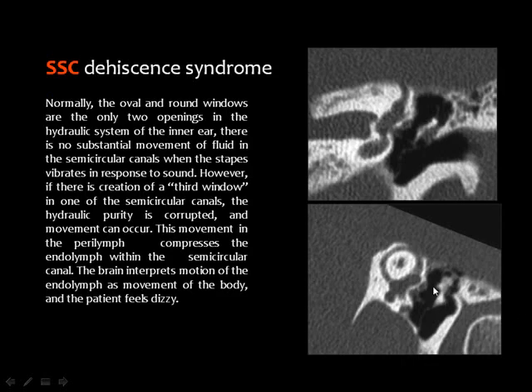And using the CT scan, we can have these very beautiful images for the superior semicircular canal reconstructed in a sagittal oblique image. Then you can see most of the superior semicircular canal is separated from the cranium by bone, except for this area, representing the superior semicircular canal dehiscence syndrome, which is also beautifully seen in this coronal image. This is the superior semicircular canal, and no bony ridge is separating the canal from the brain. This is the vestibule, and this is the cochlea, internal canal, and middle ear cavity.